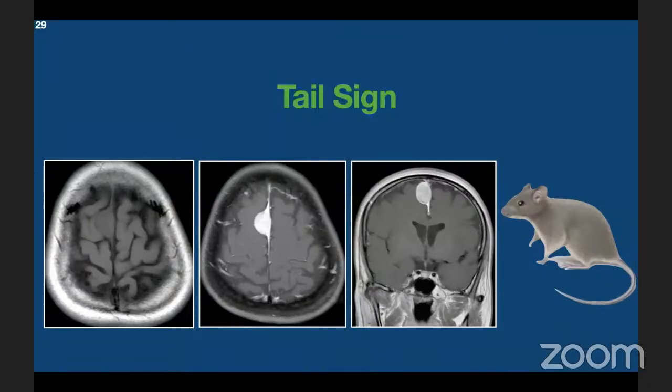The dural tail represents extraaxial lesion. Meningiomas are associated with dural tail in at least 60% of the cases. The dural tail sign, however, can occasionally be seen in acoustic neuroma and metastatic tumors.